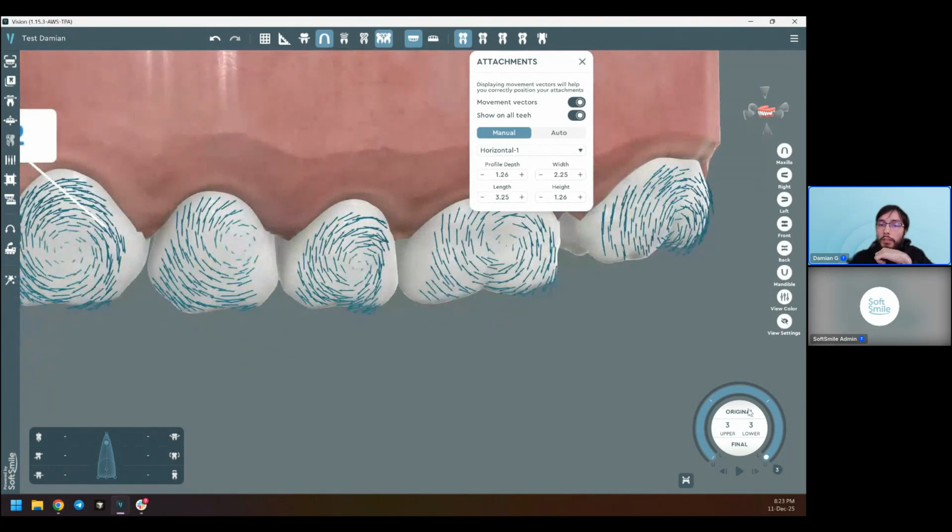The thing is, you will notice that if we have different key points and there are different types of movements between pairs of key points, so you do first rotation and then you do translation, say, the arrows for the initial type of movement are going to be one type, and then for the other section of movement, they're going to have a different kind of arrangement of these arrows. So I hope that's what you mean by final force vector after staging.